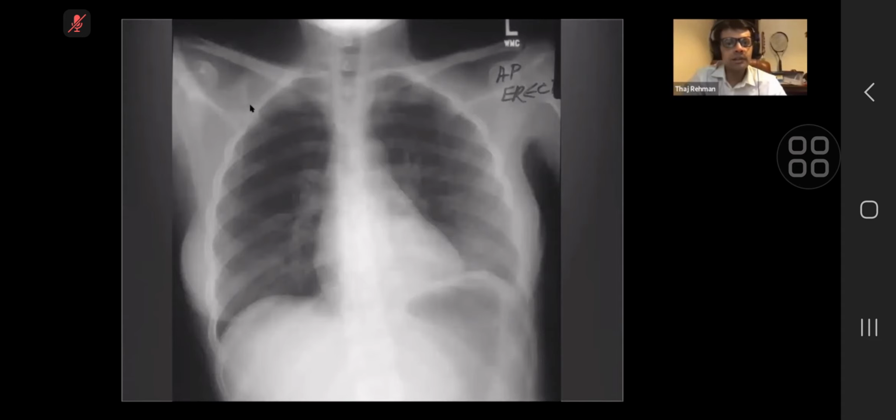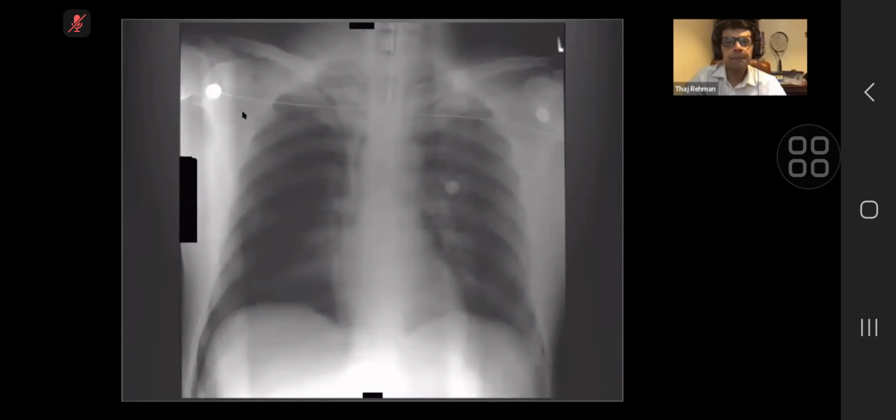There's also a fracture in the scapula. Very unusual. But look for fractures and get your eyes used to picking up the visceral pleural line and the pneumothorax air in the apex. Always look for that. Okay?